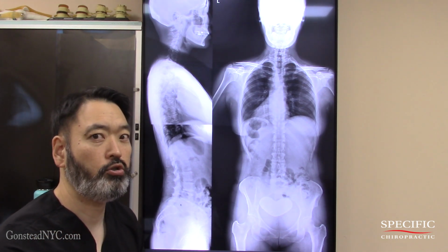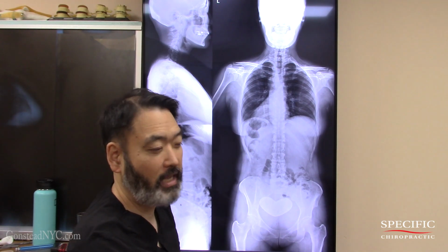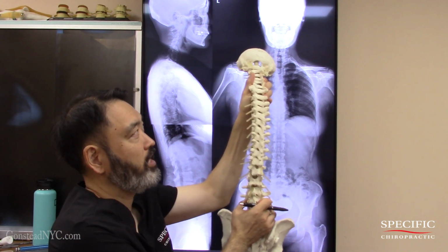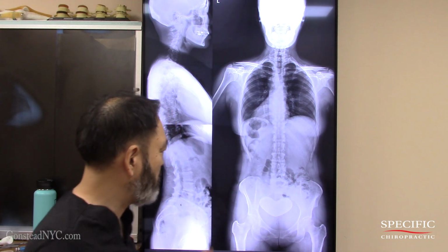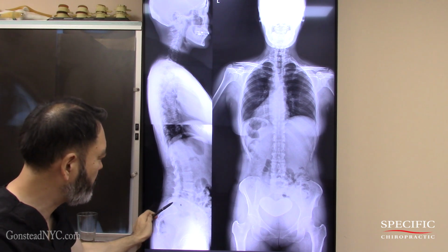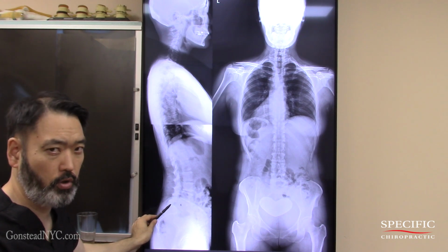So then we go to the biomechanical analysis. The atlas is anterior on the right-hand side, so that tells us the whole head is rotating this way, and the occiput is rotating the opposite way. Then we take a look at what the sacral base angle is doing over here. Is it too posterior? Is it too anterior? Or is it in neutral position? This is just slightly posterior.